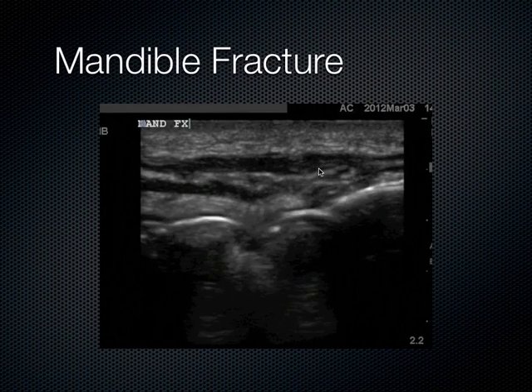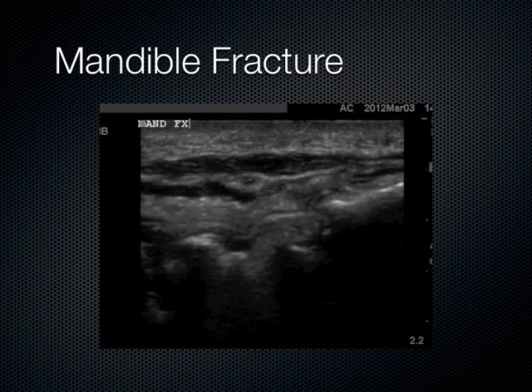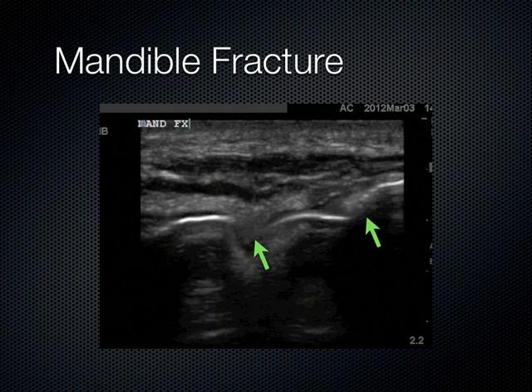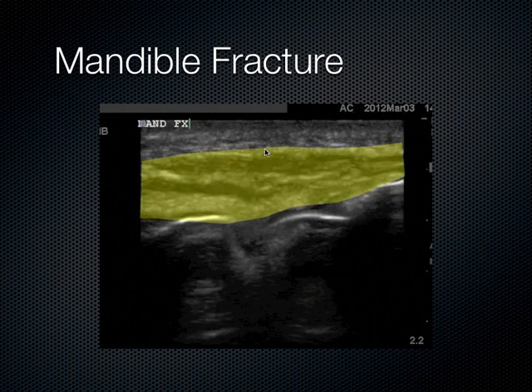And this is a comminuted mandibular fracture, which means it's in different pieces, and the disrupted cortex is located at two different places, marked by those green arrows. You can see accompanying superficial layering of fluid from all that soft tissue swelling anterior to this whole process. Many times we see a lot of edema or even hematoma formation above these fracture patterns. So one part of the mandible is here, then there's a step off, then there's another bone here, and the other bony landmark is over here. So this is comminuted, broken in two different places.